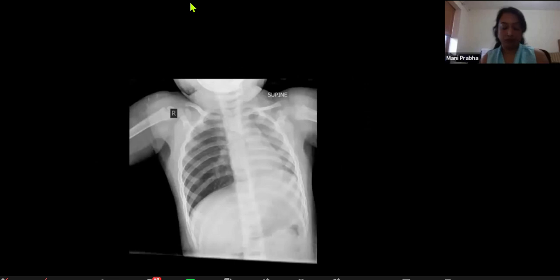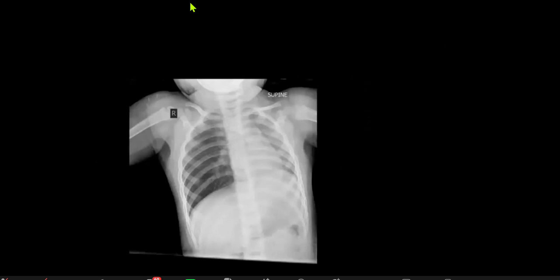Expiratory radiograph. Okay. So expiratory radiograph demonstrates air trapping in the right hemithorax, which would be in keeping with a foreign body inhalation. There is an impression of an increased opacity projected over the 6th or 7th rib, which may represent a radiodense foreign body.